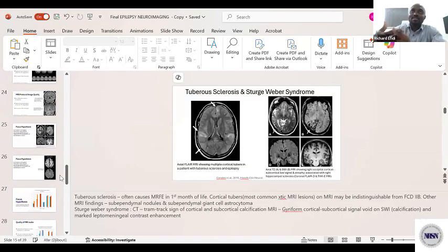So the usual axis in which MRI images are acquired is the AC-PC axis. AC is the anterior commissure, PC is the posterior commissure. So the line of axial acquisition is along the AC-PC axis for axial images.